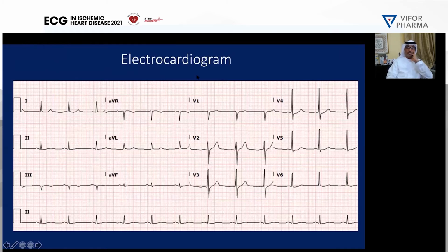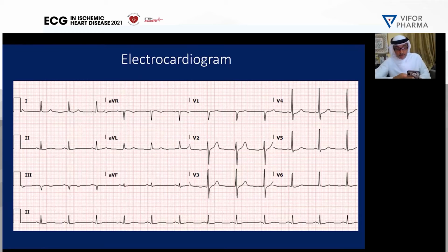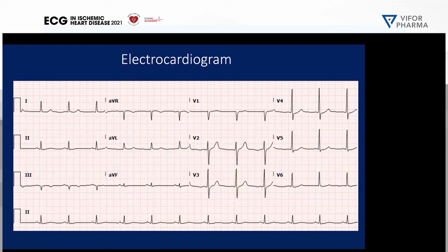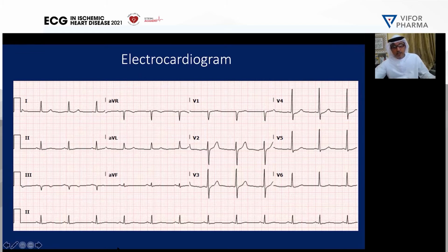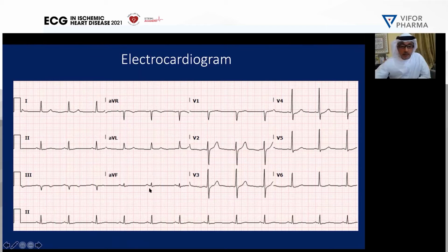So, you did the ECG, and if we go systematic, what do you think? Let us go again by the protocol. Rate, rhythm, axis, intervals. This is very important. Number one, what is the rate? Four big squares, so 75. Okay. Rhythm: P, QRS regular, complexes regular. Axis: normal axis, lead 1 and aVF are up.